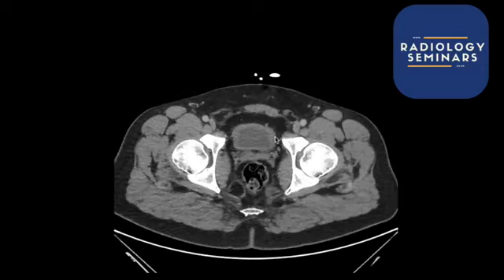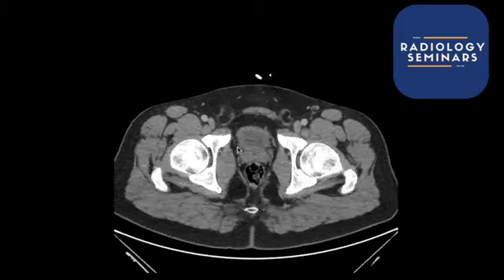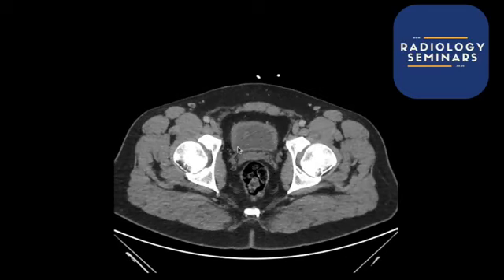I've had situations where the catheter balloon is nowhere near the urinary bladder, and there's a very distended urinary bladder. On occasion, you may see a mass. Usually in older patients, you might have a bit of a diverticulum sticking out on either side. But generally speaking, like in this particular example, the urinary bladder is not very well filled, so I would be hesitant to say there's anything abnormal. If you're really concerned and you think it is a bit thick-walled, you could say the urinary bladder is thick-walled but not adequately distended, and may need further investigation with a dedicated ultrasound study.